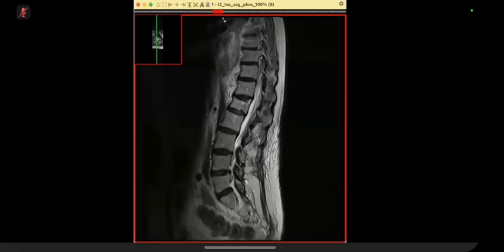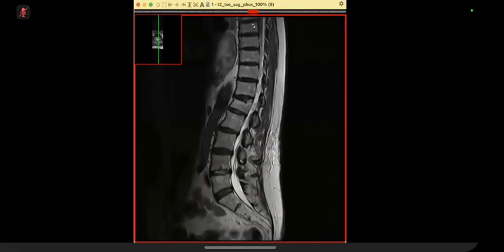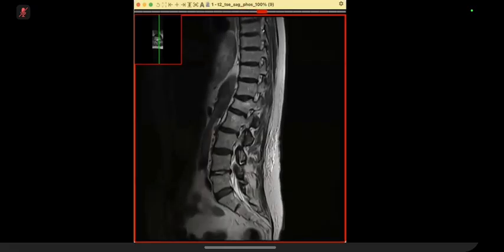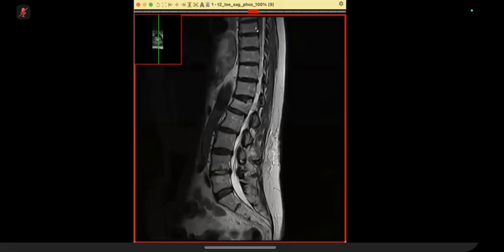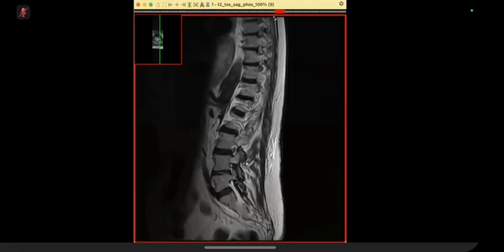This is the exit foramen. I'm going now for the other side. So what I will do is I will guide you when you go to the parasagittal, which parasagittal are you, right? Sure. So yes. Now I am moving to the left. You are going to the left. Yeah. I can see also there is intervertebral disc bulge or protrusion.